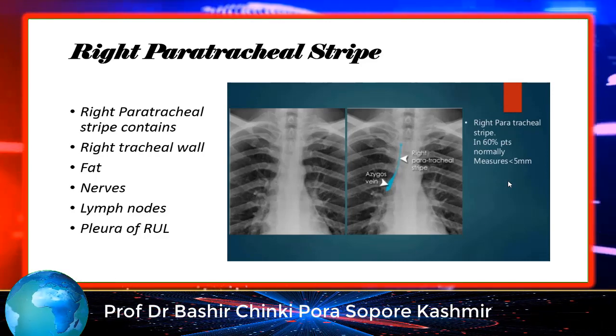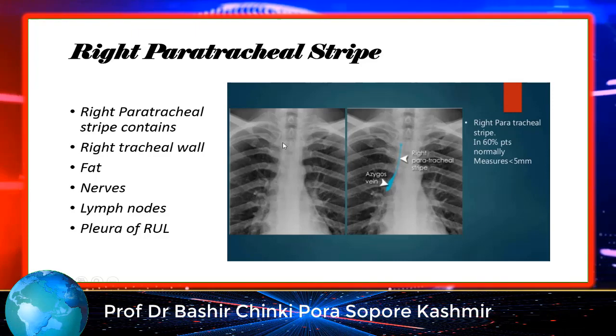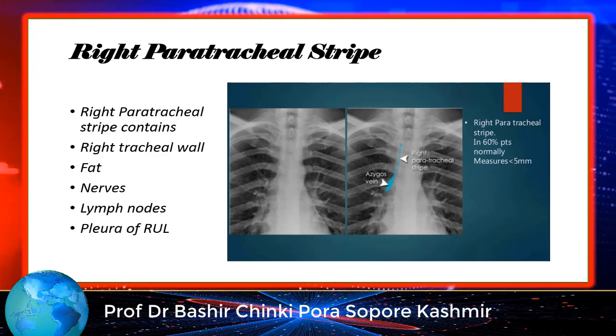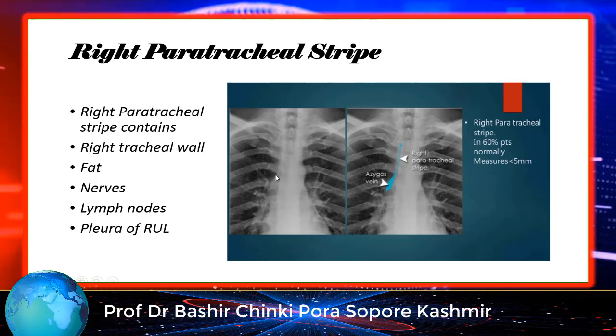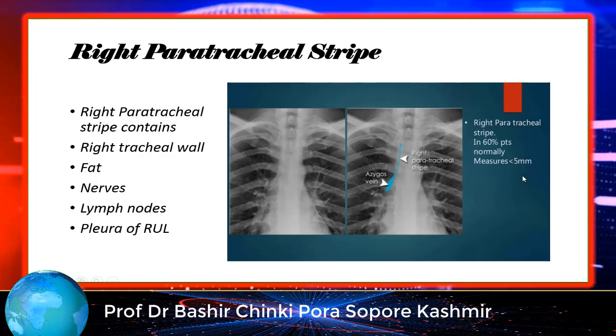And as I said, it should not be more than 5 mm. If it is more than 5 mm in thickness, then it means it is thickened. It should be less than 4 to 5 mm.